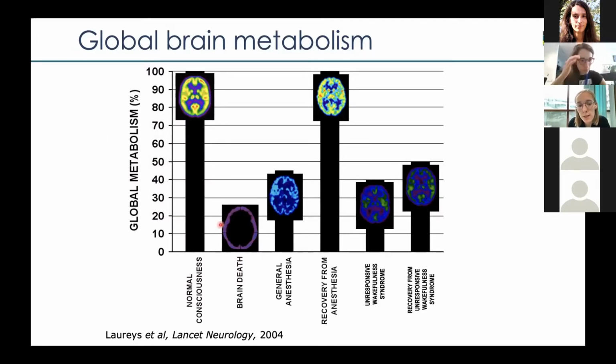If a patient is brain dead, then you see only glucose uptake in the skin surrounding the skull, but you see kind of a black box, right? You don't see any uptake in the brain itself. So this is a patient that is brain dead and cannot recover consciousness.